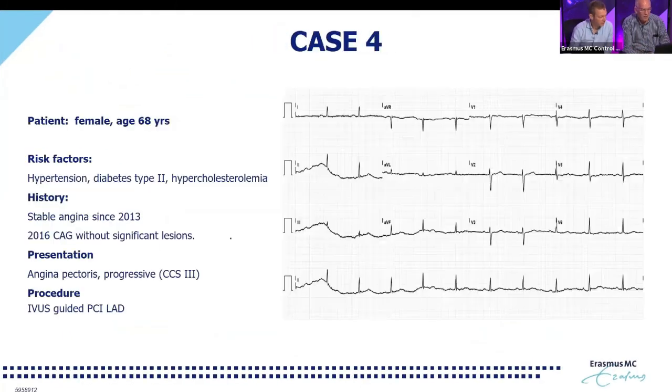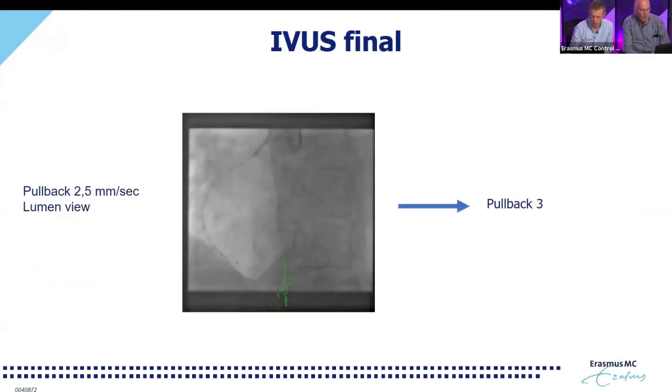we conclude with this. So we hope you enjoyed this 4th edition of our IVUS course we do together with ACIST. We hope that in this course you learned something about the different phenotypes of plaque and calcium and thrombus you might encounter in patients with ACS. How IVUS can help you to tailor your treatment approach to assess everything ranging from thrombus to plaque characterization to calcium, to sizing towards final pullbacks that will help you to adjudicate the final result.